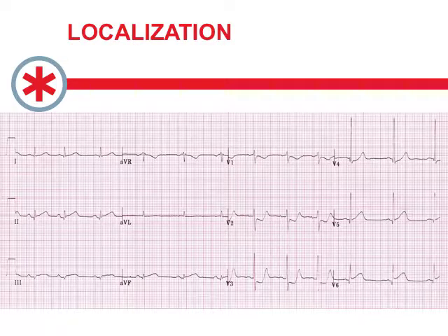All right, if I told you this was a 64-year-old patient with chest pain, why don't you have a look at this ECG and take a moment to think about what this is. Right, so I think what probably catches your eye right off the bat is the ST depression, a bit in V1, certainly markedly in V2, V3, and a little bit in V4. And you may make an argument there's a bit of ST elevation in V6, which will make sense in a second here.